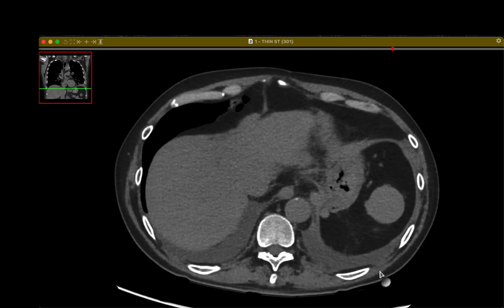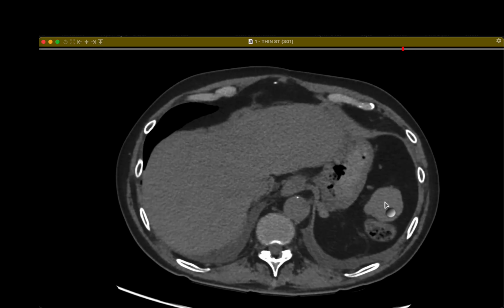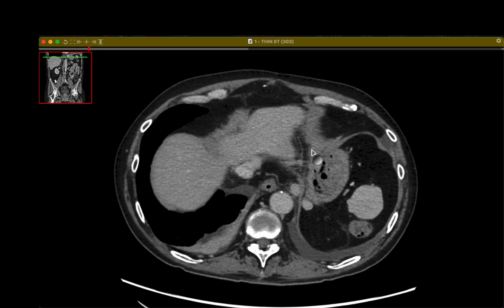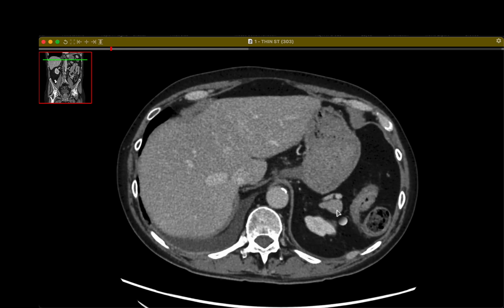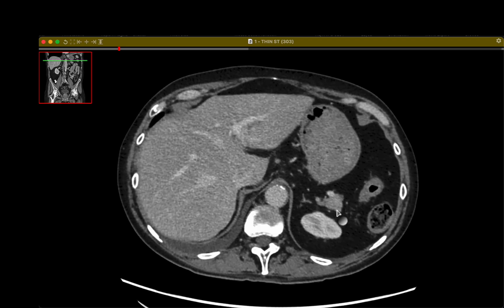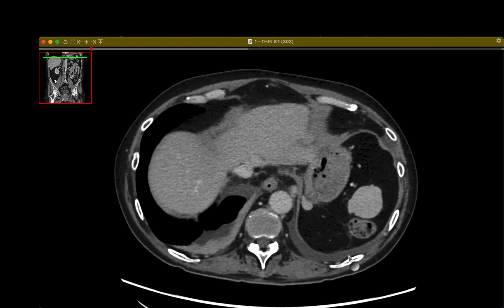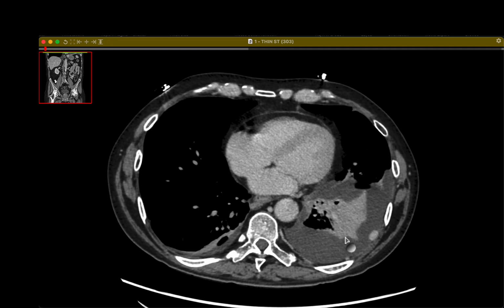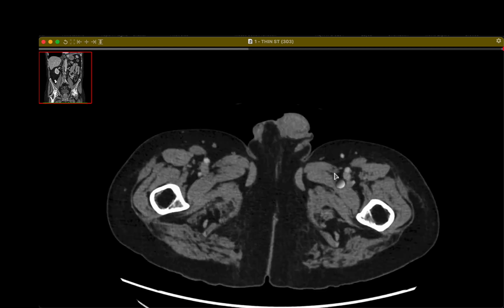And in the upper abdomen here, we see these multiple high attenuation soft tissue masses that have similar density. On the abdominal CT that followed the chest CT, we now have IV contrast, and we consider that these homogeneously enhanced during the portal venous phase, and these are typical of splenules. Turns out this patient had a history remotely of splenectomy for an unknown reason, but we can see that these implants in the pleural space are indeed enhancing along the same attenuation that we see with the upper abdomen. So this is a nice example of pleural splenosis.